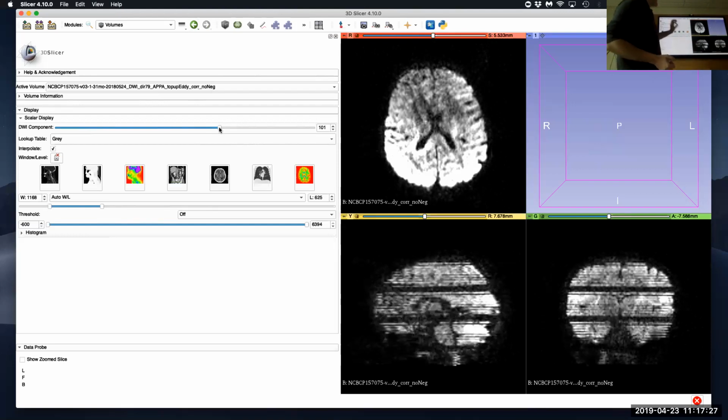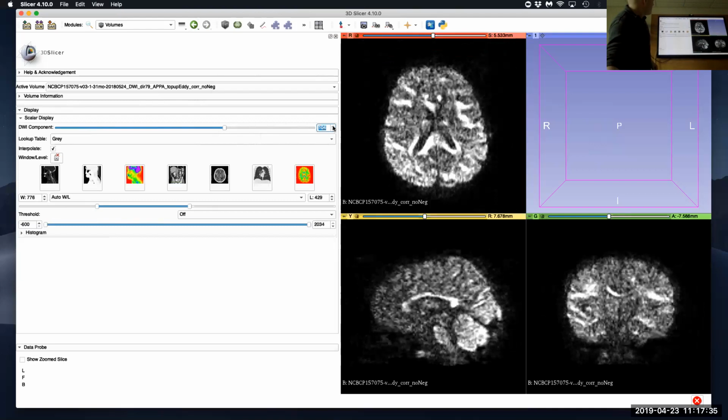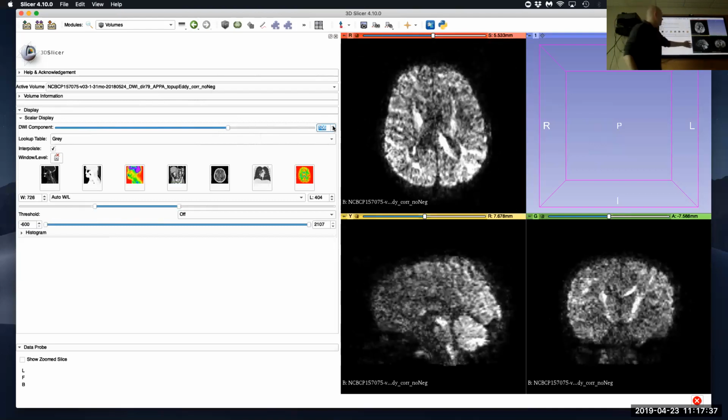So I would not use anything from that DWI. That's better. On the other hand, there may be other ones where DTI prep says, "Oh, look, there's only one slice that's rather bad. This one here, I cannot even see it." Let's say if I would take that slice, yeah, interpolating is probably fine. So that's what I mentioned last time, that there's some DWIs you probably want to throw out, and other ones where interpolating data is probably fine.